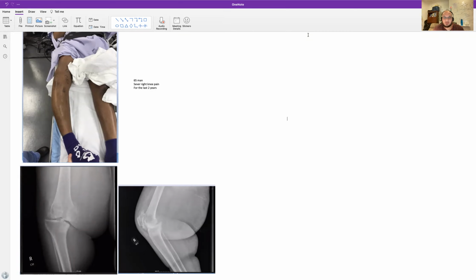So this is a clinical photograph and a couple of radiographs of the knee for this gentleman that show severe varus osteoarthritis of the knee. The radiograph shows a severe defect of the medial tibial plateau with tri-compartmental osteoarthritis predominantly on the medial side. There is subluxation of the tibiofemoral joint. So this is an example of severe knee osteoarthritis.